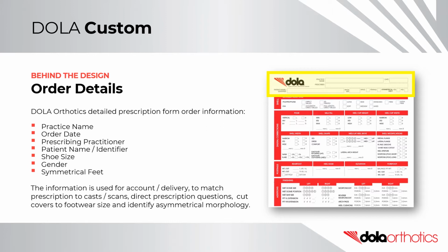Gender allows the shoe size to be matched to the gender size profiles provided by shoe companies. Symmetrical feet allows the practitioner to determine if small differences in foot morphology are to be normalized or significant differences are kept as asymmetrical. Examples include small differences in heel width normalized for the same shoe size versus asymmetry in a unilateral clubfoot kept as the patient wears two different shoe sizes.